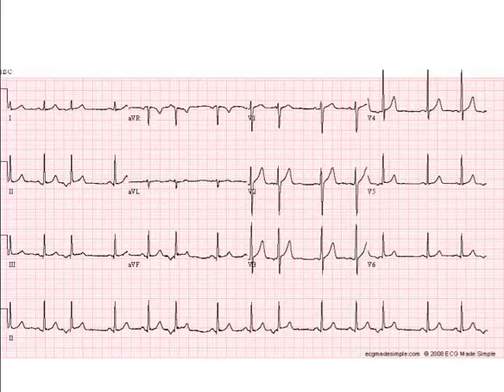This is an ECG of a 47-year-old woman seen in the office of her general practitioner complaining of palpitations. She describes the palpitations as the sensation of isolated, irregular pulsations in her chest, more often occurring in the evening when she is tired or stressed. Otherwise, she is well. On examining this ECG, we first want to assess for the presence of P waves.